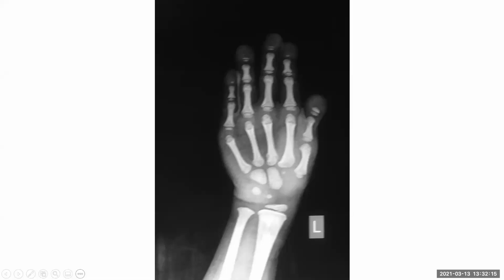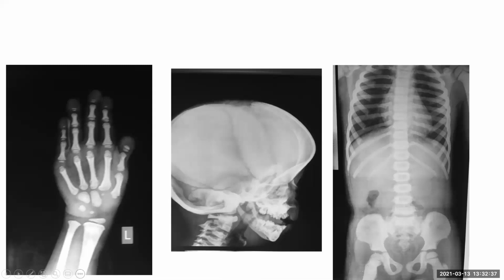Okay, there is no previous present. Would you like to do anything for the patient? This patient came with short stature. So if it's short stature, I would think about pycnodysostosis. So a skull radiograph will be helpful, looking for the mandible, especially wormian bone. So this patient had these radiographs done.